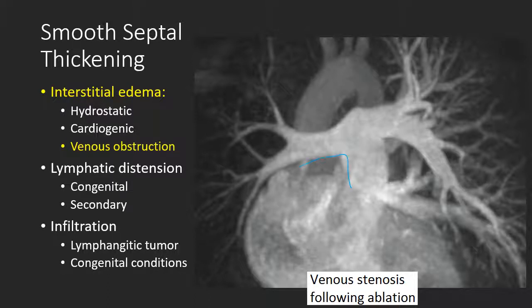Here we can make out the pulmonary artery, and the pulmonary artery is in here. And then we could also make out the pulmonary veins on the left side, which are over here, draining into the left atrium. But note there's absence of pulmonary veins on the right, and that's because they're stenotic and occluded, no longer filling, resulting in that appearance of unilateral pulmonary edema.